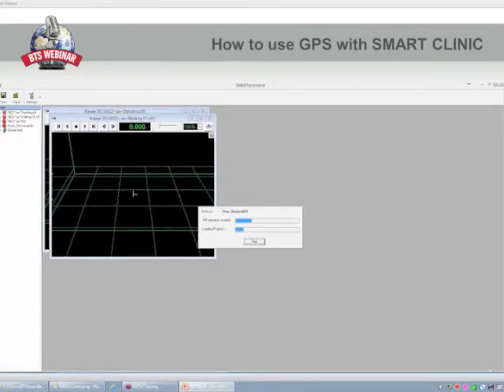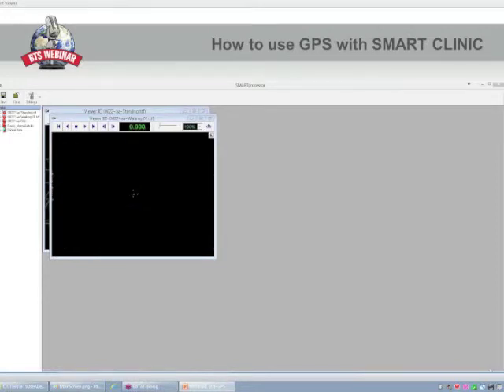Okay, so they are all okay, so we can go on with the processing, and the next step will be to save the results, so to save the processing by clicking on the Save button, and the data will be ready to be loaded into the report. Okay, so now I can click on Save.